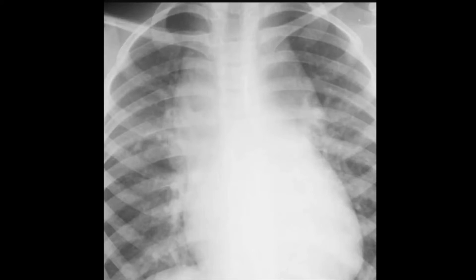We'll start this video by reviewing the two quiz cases from the end of the prior video. The first quiz case was regarding this image, and the question was, what is the sign and what is the syndrome? The pertinent information I gave before was that this is a patient with a shunt.